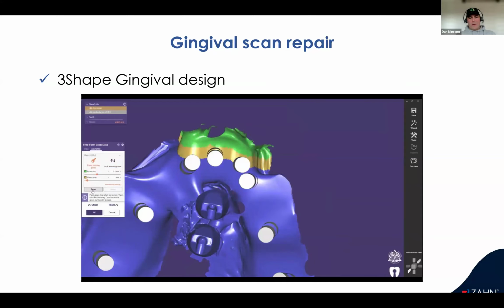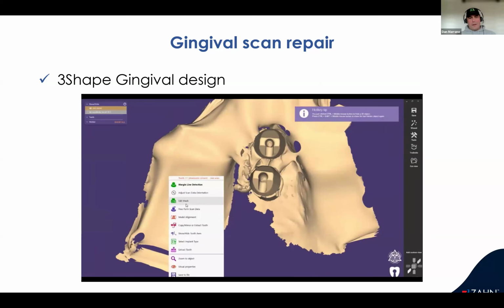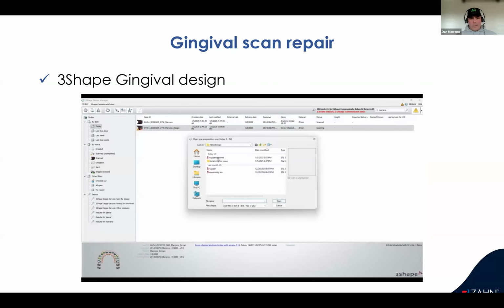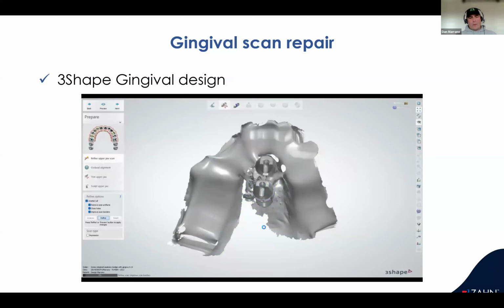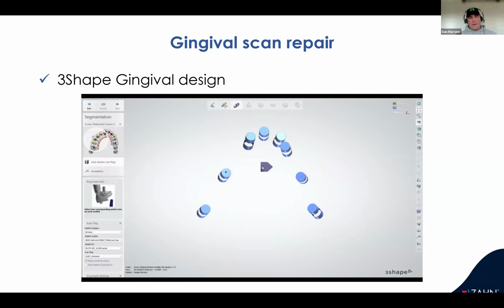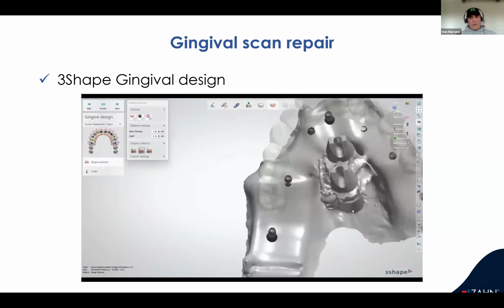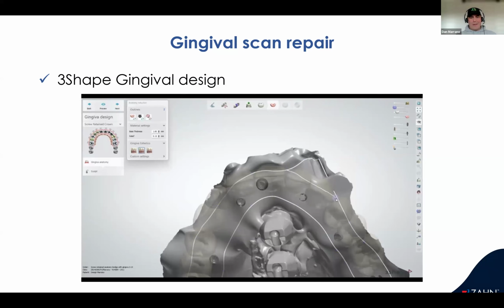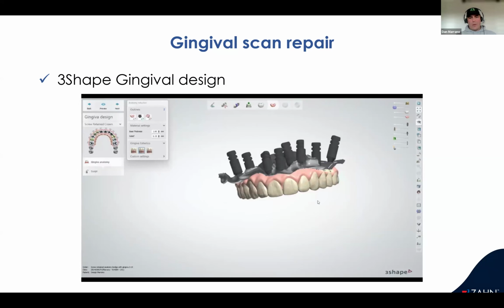I make sure I bring the scan bodies in just to make sure I'm a little bit further out than it was. And I'll show you in another one next, I'm rotating that in exocad to see any kind of sparkles. And when I see the sparkle, that's an artifact hanging there, and I'll cut it out. But as you see, now we have a nice blank canvas. I do bring the original one in as a pre-op, but now our tissue works.